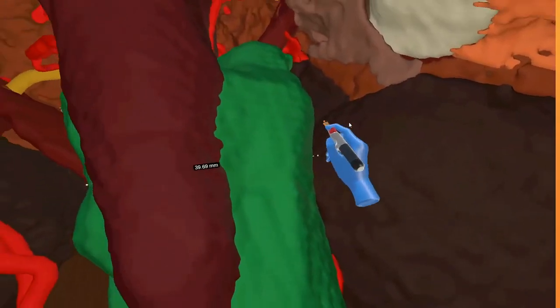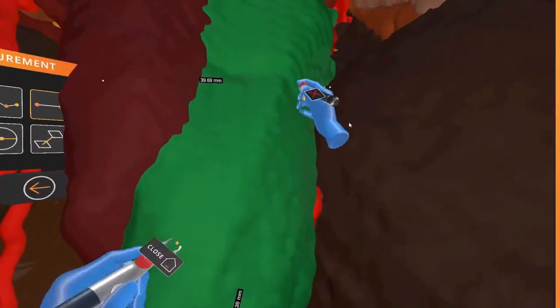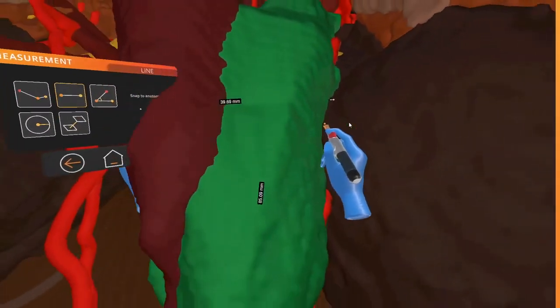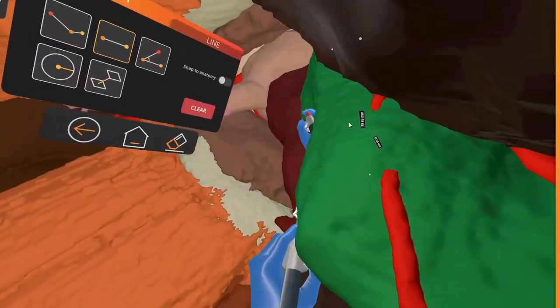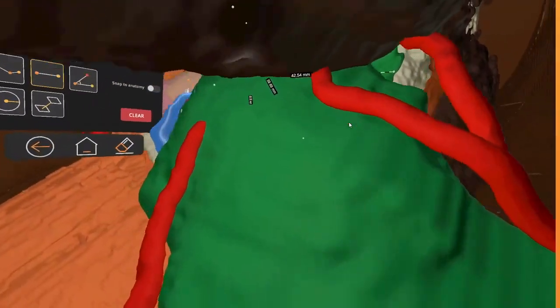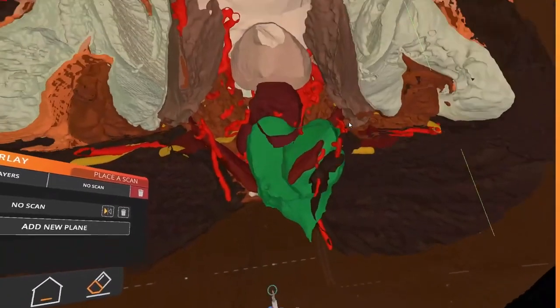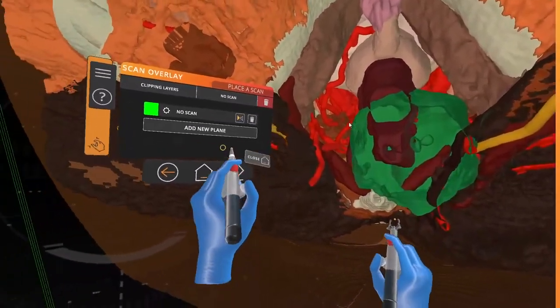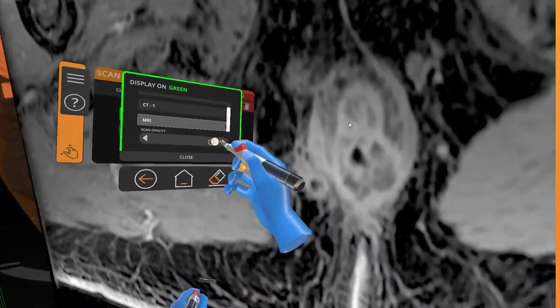It is multilobulated and septated, measuring 4 by 4 by 8 centimeters. The complex three-dimensional geometry of the lesion is best understood when viewing it in 3 dimensions. We can layer cross-sectional imaging onto the three-dimensional model to enhance our understanding of the relationship between the lesion and the surrounding structures.